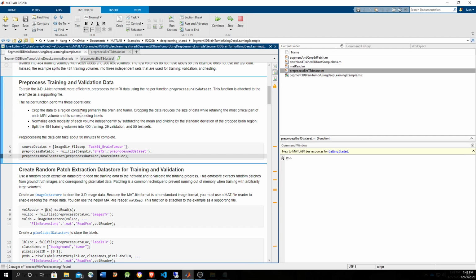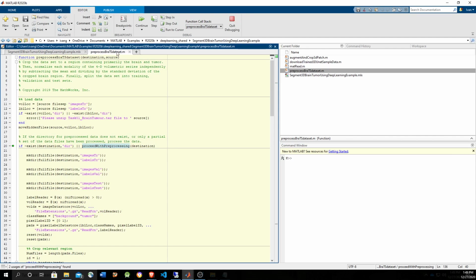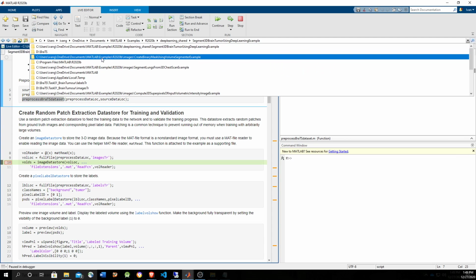Okay, so let's get out of the pre-processing. No, this is not the right place. Okay, let's just hit F5 to get out of here. Okay, nothing was done here because the proper processing was already done.